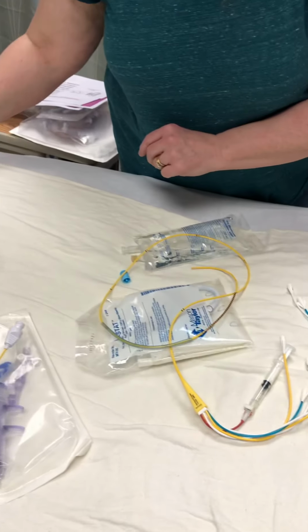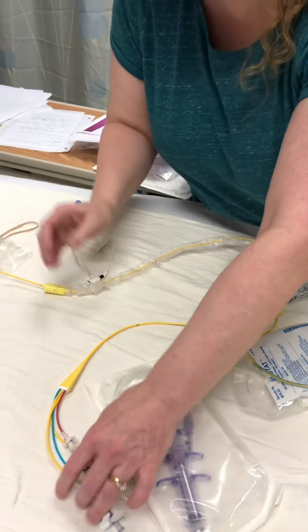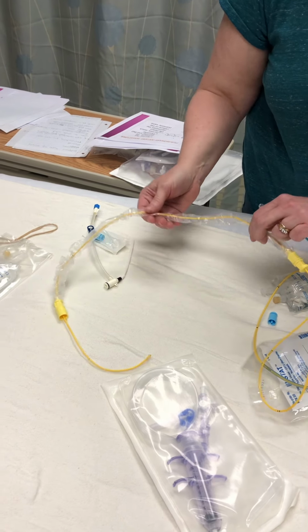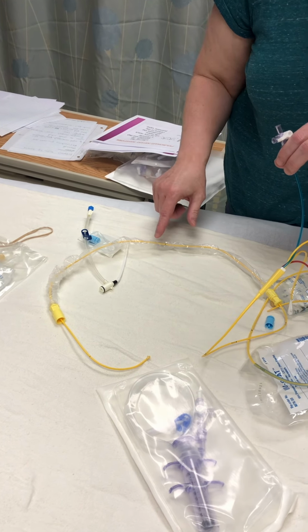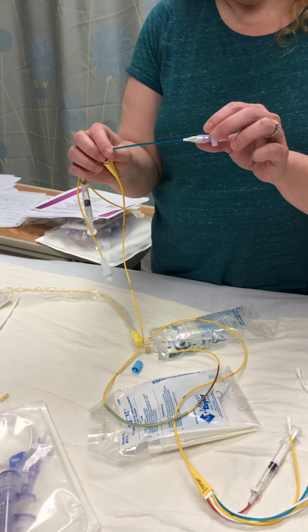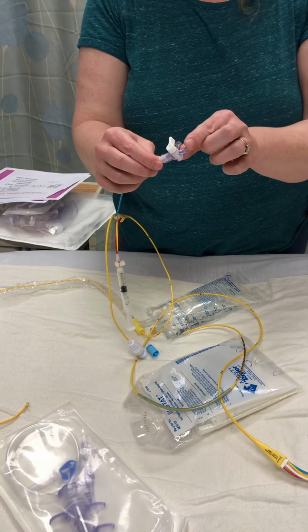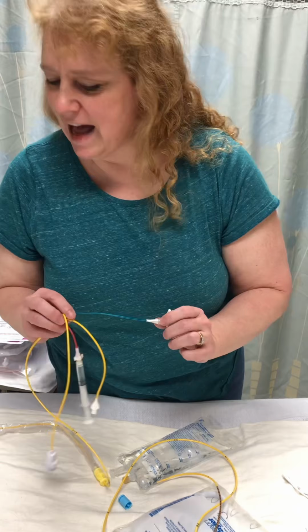In the manual, the way you get your cardiac output is when you inject fluid in here, it comes out around here somewhere, and then the machine will measure how long it takes that change in fluid temperature to go from the Swan to the very end. And that's how it measures it. So another reason why you just want to have a maintenance fluid, a TKO in here, if you're injecting fluid in here, you really don't want to have pressors in here. You don't want to give them a nice little bolus of Levophed. That could cause a lot of problems in your patient.